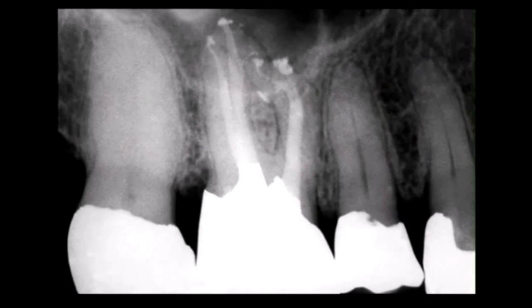In this maxillary first molar, the mesial buccal root in its apical 1/3 is quite complex. This is an example where manual finishing procedures are indicated. Again, in a mandibular second molar, you can see that the distal root has trifidity in its apical 1/3. Whenever the canal makes a sudden change in cross-sectional diameter, this would be an indication where rotary instruments may separate.